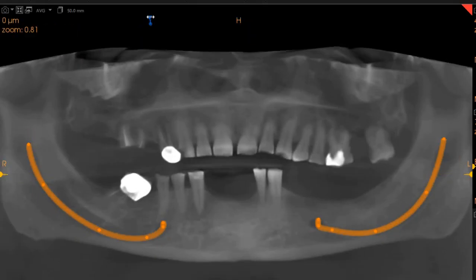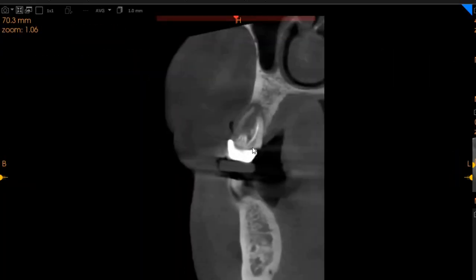Starting with the maxillary upper right second premolar, first premolar region. This is the first premolar. This is a grossly carious tooth. We've got a periapical infection and a periradicular infection, quite severe. Very thin buccal cortical plate is left as a consequence of this infection, but just in case, this is extracted: 10 millimeters of width and 15 millimeters of height.